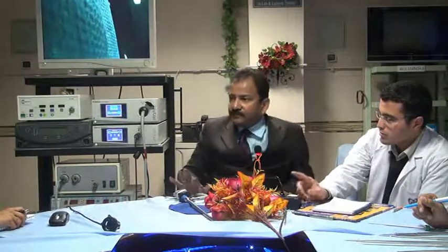But if you have the 3-chip HD also, you can do simple surgery. But with the standard definition, you cannot expect to do the bariatric or colorectal. You will be in trouble, or a splenectomy, you will be in trouble, because once the vision is not good, your performance will be affected. Now, focusing.